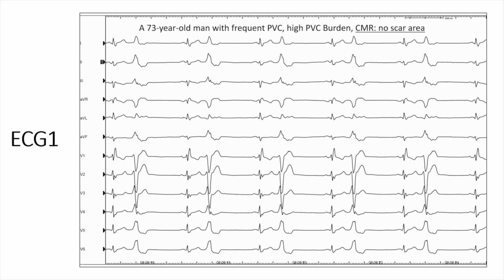Actually, at that location, we don't expect a positive aVL in the ECG, but it looks like there is some special conduction from the pulmonary artery to the free wall of the RVOT, putting together a left bundle branch block pattern, late transition, which means a right ventricular PVC, inferior axis shows outflow tract, notching depicts the origin on the free wall of the RVOT, and the positive lead 1 means it's more posterior. aVL positive means that the PVC should be in the lower part, but this is one of the examples and exceptions of PVCs originating from the pulmonary artery.